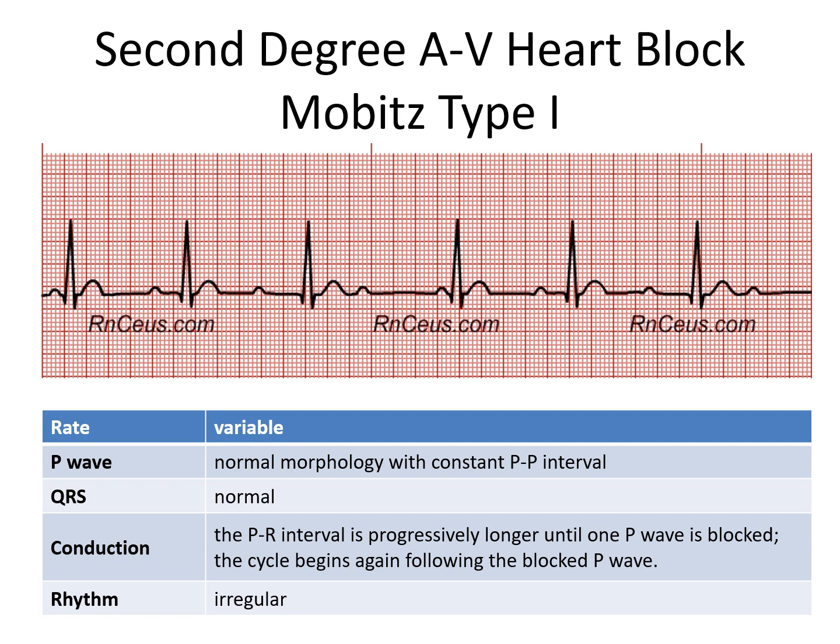So let's look at this. It appears to be, there's a P wave, QRST, P, QRST, P, QRST. Then there's a P, but the impulse is not conducted. It doesn't make it through. There's a block somewhere preventing it. There is a P wave, but there is no contraction of a ventricle following it. Okay, so that beat has been dropped.